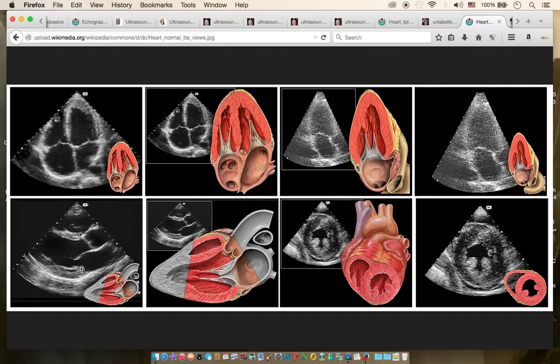This is the posterior leaflet of the mitral valve. This is the left atrium. And if there is any mass, for example, this is the anterior wall, this is the posterior wall of the aorta, and this is the anterior wall of the aorta. Sometimes you might see here a pedunculated mass, this is a myxoma, for example, and it's attached to the interatrial septum. You can diagnose this by the parasternal axis. This is the posterior wall of the left ventricle. This is the inferolateral wall of the left ventricle.